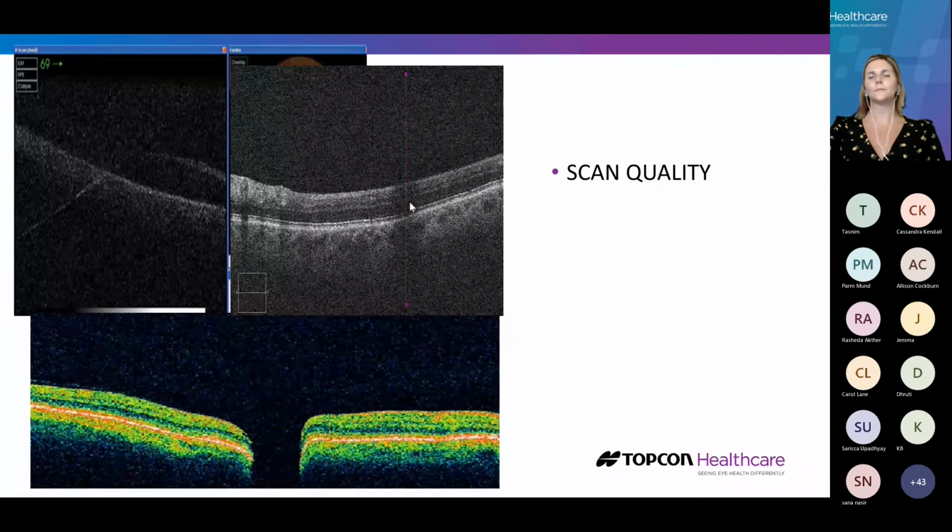and that's meaning that we can't really clearly interpret that part of the scan. The bottom image, for those of you that may have seen scans before or maybe using an optic disc scan, this does look a little bit like it could be the physiological cup, but actually it's not. It's missing data. So this section here hasn't got any data. So we're not seeing that bit of information about that patient. So we would want to encourage that scan to be recaptured. We have to be very mindful of artifacts, and we'll come on to that as we continue through the session.